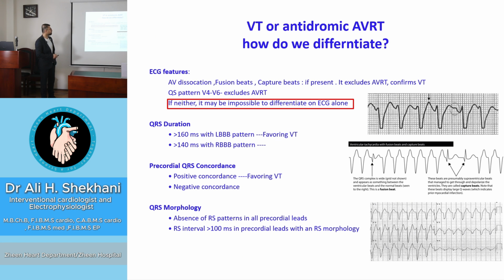And we have capture fusion beat also, if it is present, indicate VT. What is capture beat? This is capture beat. It means there is some normal sinus beat among the VT runs. And we have fusion beat when there is a fusion between VT and sinus beat. This beat is also specific for VT.